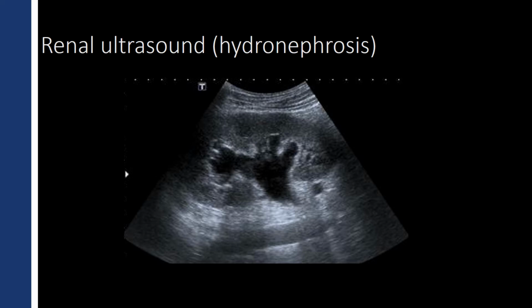The only time we see the renal collecting system or the ureter is if there's an obstruction. And in this case, what happens is urine backs up and causes hydronephrosis. Hydro means water, nephrosis means kidney, so hydronephrosis, water in the kidney. It's just urine distension of the renal collecting system. Hydroureter would be urine distension of the ureter. And so what we see on this patient with hydronephrosis is we see, again, that dark renal cortex. We do see some of that medullary fat, although the fat's compressed and is less noticeable than before.